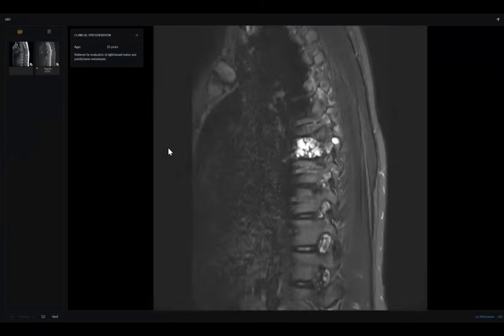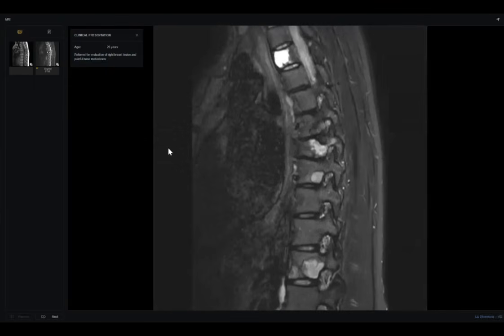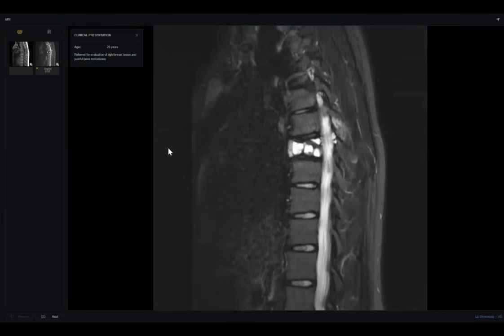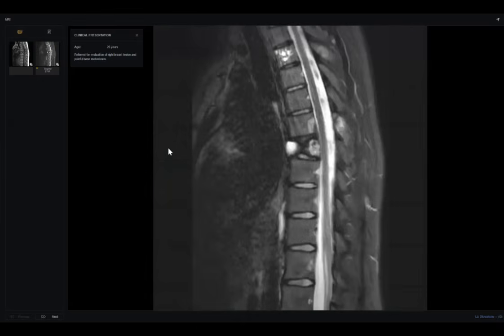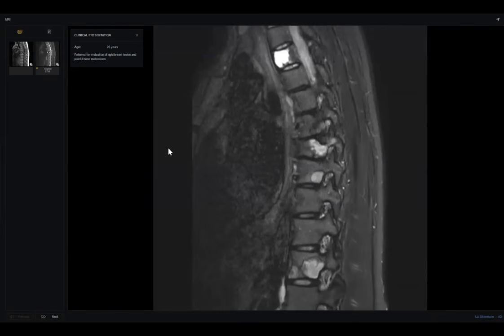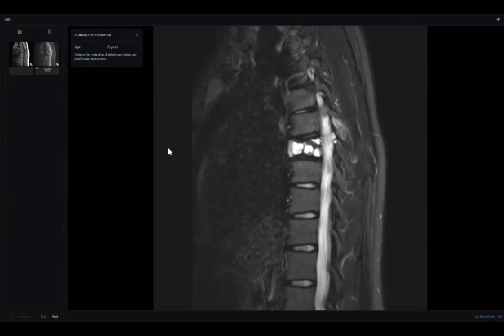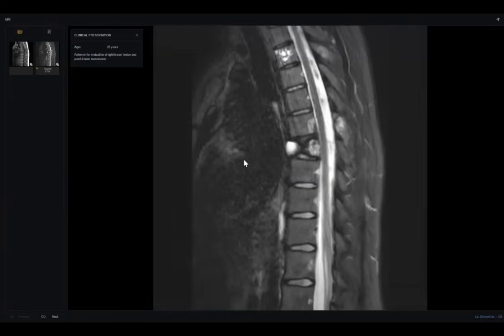Okay, what happened here? With MRI. I presented with MRI T2 on the spine, sagittal plane. I can see there are multiple hyperintense signals within the dorsal vertebral bodies, and there is vertebral collapse along the mid thoracic vertebrae. But this vertebra is collapsing. What do you think? What's your final diagnosis?